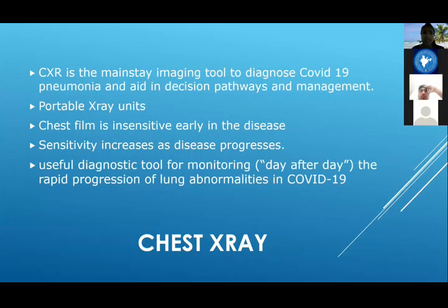And the disadvantage is that, as you all know, it is insensitive early in the disease, because if you take a chest X-ray in the first 3 days, in most cases it will be negative, the lungs will be clear, but definitely sensitivity increases as disease progresses. So the main use of chest X-ray is that it is a useful diagnostic tool for monitoring day after day the rapid progression of lung abnormalities in COVID-19.